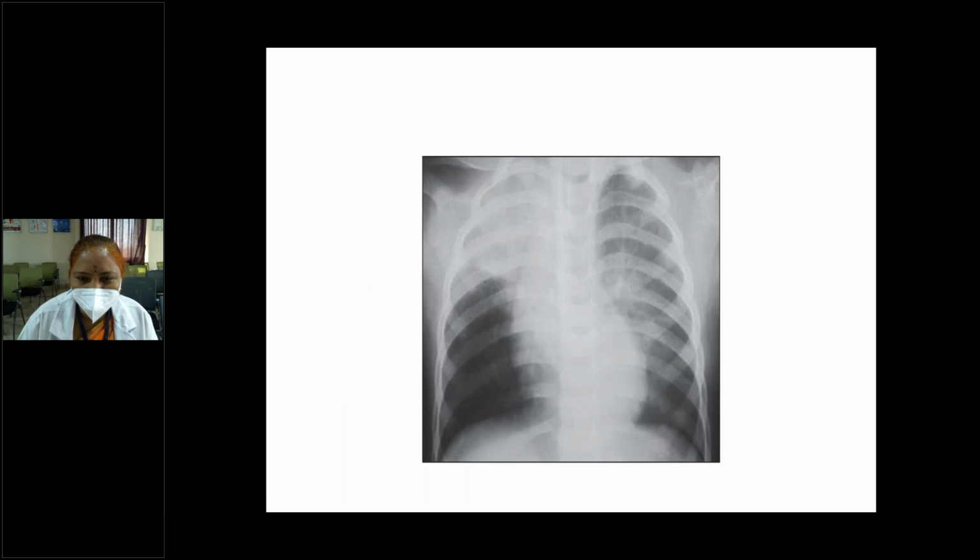Anybody, this X-ray chest? It's a plain X-ray chest of anteroposterior view showing thorax and upper part of the abdomen. Right and left borders of the heart are clearly visible, with costophrenic angles not obliterated. And the apex of the right lung is hazy.